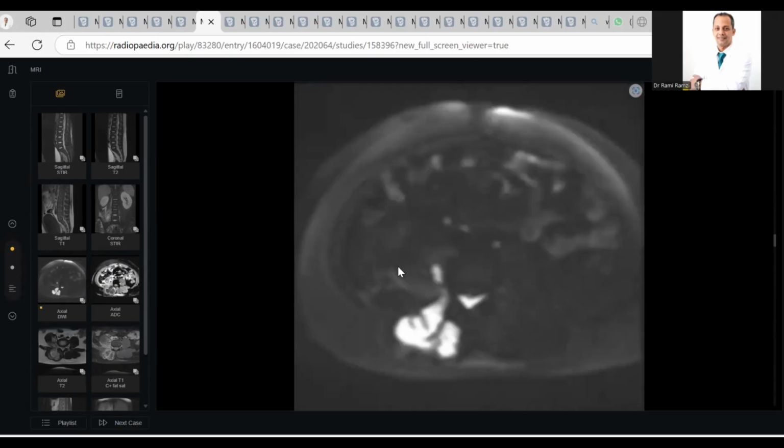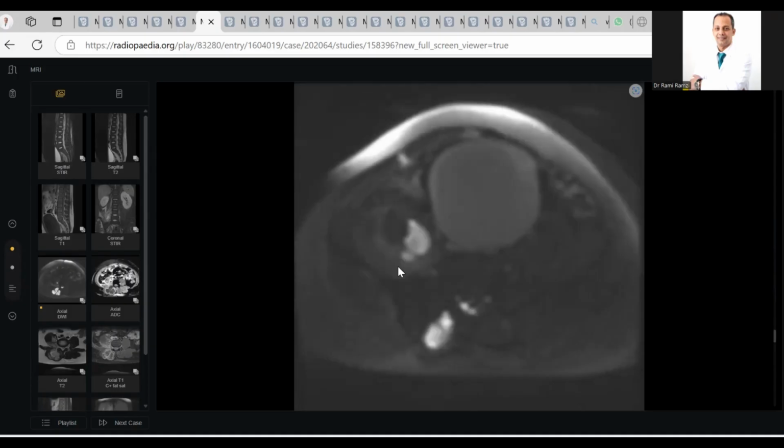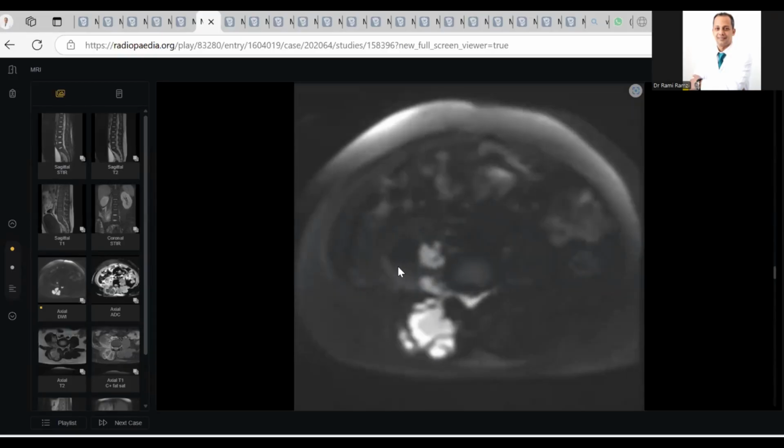Give me differential because Zoom will shut down. The differential would be a secondary infective etiology with epidural abscess and paravertebral and perivertebral abscesses. What is the next step? Most important next step, I will immediately inform my finding to the referring physician, and this patient should be referred to the spinal surgical team, and this patient requires a drainage of the abscess collection, and in this I will look at the spinal cord if it is normal.